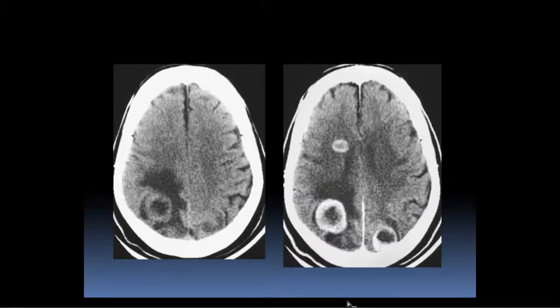Here, after contrast, we see a couple more lesions. We see nice peripheral enhancement. So now what do we think it is, most likely? Metastatic disease becomes much more likely than a multifocal primary tumor, right? Although multifocal primary tumor can happen, we're thinking metastatic disease most commonly.